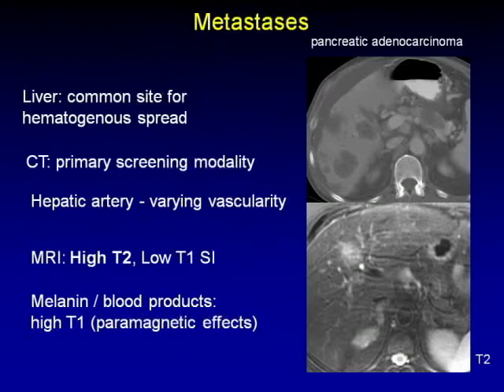But when you look at the venous phase, when the portal venous blood comes in and it enhances all normal parenchyma, that tumor is not going to light up because it doesn't have normal liver parenchyma, so it'll look dark on CT. Hypervascular tumors have a lot of arterial blood supply, so on the arterial phase, they're going to light up and be brighter than the background liver. Then on the venous phase, they don't have that portal venous supply, so they will wash out as the arterial phase washes out.